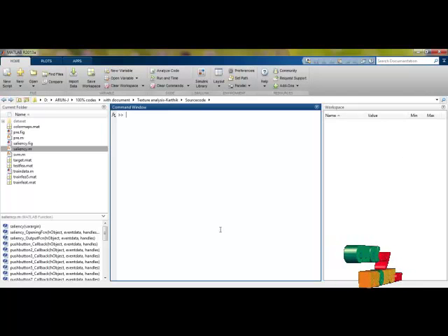Let's see the running procedure of our product. Here the directory shows what files are included in our project. The .m files indicate program files written in MATLAB. The .mat files are matrix files that include matrix values used during the program. The .fig file represents the GUIDE design.